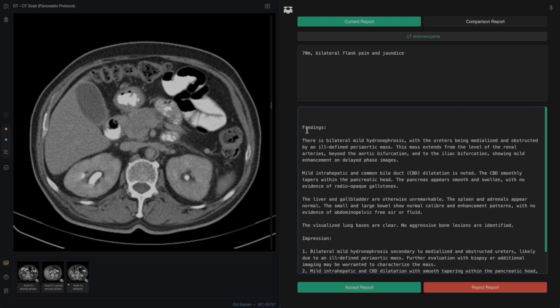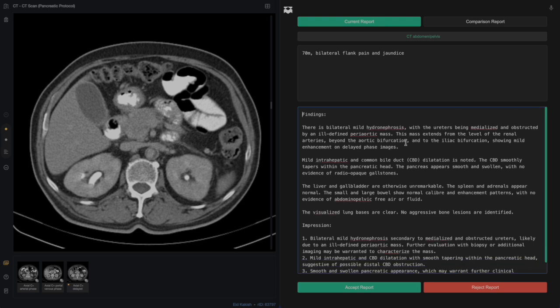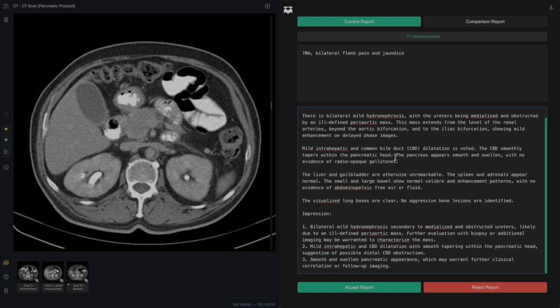Yeah, comparisons made. That's fine. That's good. It's good.